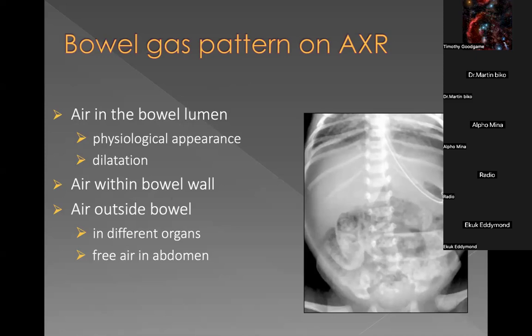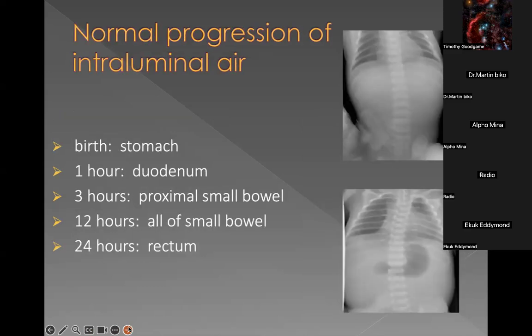So I would like to divide my whole lecture into these three different categories and three different compartments within the abdomen where the air could be positioned. So let's have a look at the air within the digestive tracts.